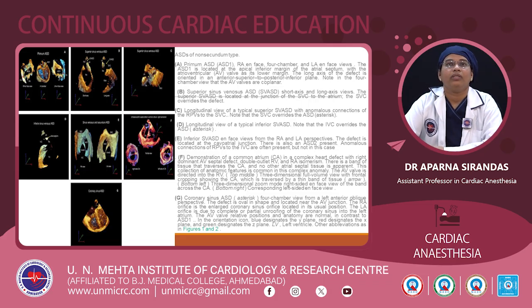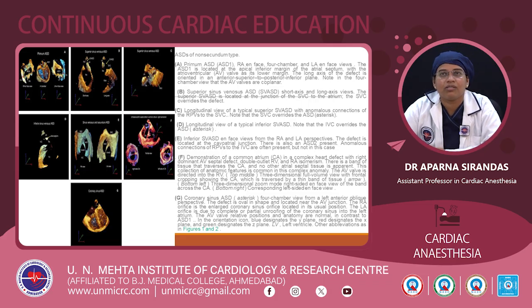Coming to the B figure, it is superior sinus venosus ASD, short axis and long axis views. The superior sinus venosus ASD is located at the junction of the SVC to the atrium, and the SVC overrides the defect. C is a longitudinal view of the typical superior sinus venosus ASD with anomalous connection of the right pulmonary vein to the SVC. Note that the SVC overrides the ASD. In this you can see that asterisk.